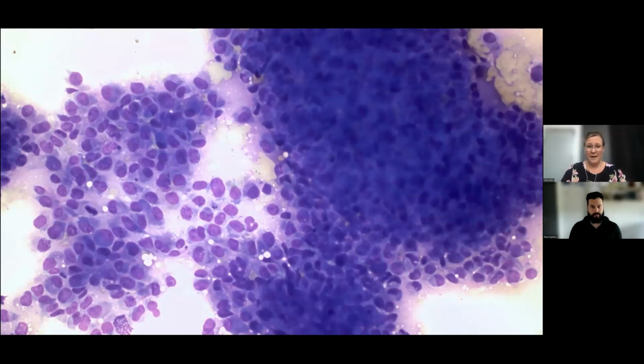So already off the bat, this is very abnormal that we can see all of these cells here on this slide. And it's a little bit difficult to see them in detail here at this lower objective view. So we're going to get closer, but I really wanted to drive home just how cellular this is. We also in cytology like to look at multiple objectives because, just like Dr. Appleby had said, we want to start a little bit farther back, but we really then want to hone in on what we're really focusing on and get more detail there.